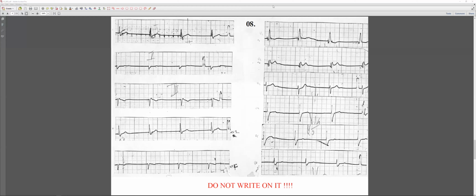Okay, I give you a tracing for sure. Yes, a good tracing. All right, Savina. Okay, wait. Is it this one, or is it a different one? I cannot see you.